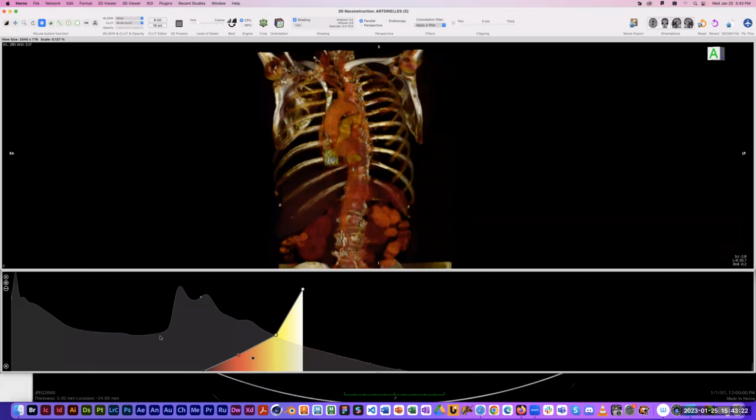And then there are somewhat fewer pixels in these darker grays, the 80%, 70%, 60% gray. Then we get in the middle of the value range, around 50% gray, and we get a couple more peaks. That would correspond to tissues of intermediate density, like muscles and some of the internal organs. And then at the far right-hand end would be our lightest value pixels, which would be our bones and any metal or anything that might be present in the body.